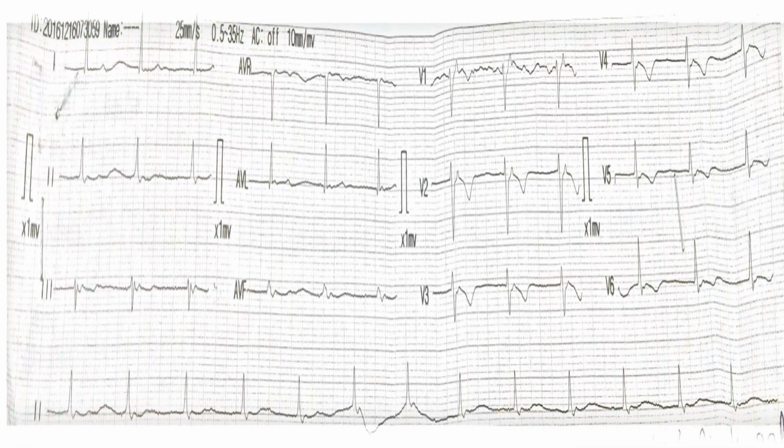So this is the ECG which is recorded now. What we see on the ECG, first of all, we have to see what the sinus node function is like and the AV node. So let's go and check both of these. Let's start from here. Let's take into account lead 1. We can see that there are a few P waves here, here, here, and obviously somewhere here, here, and here as well.